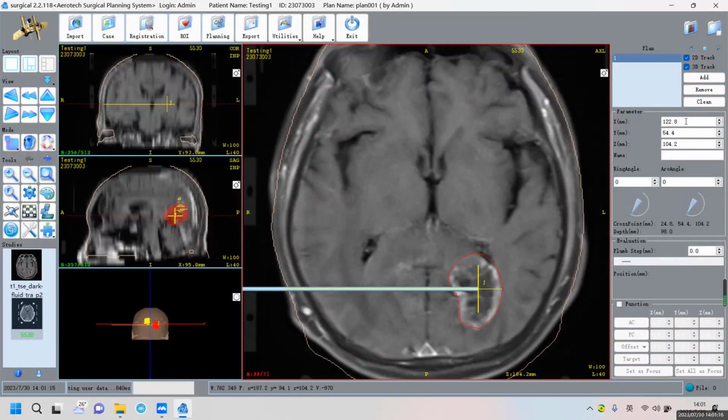Then we can see on the right, these are the XYZ values. Normally we can make some changes. For example, this is 0.8, we can move it to 0. And this is 0.2, we can also reduce it to 0. And this is 0.4, we can leave it alone. And when we do the setting, we can set the value around 0.5, more or less.